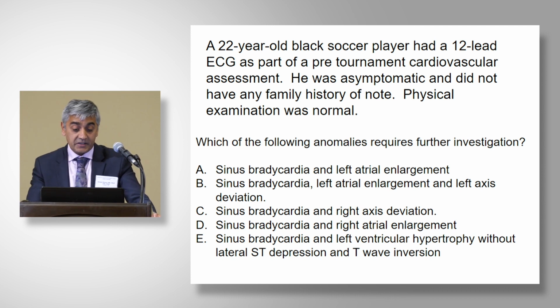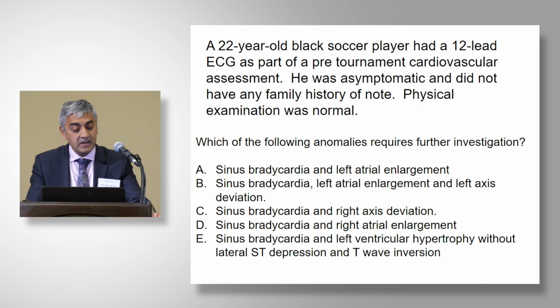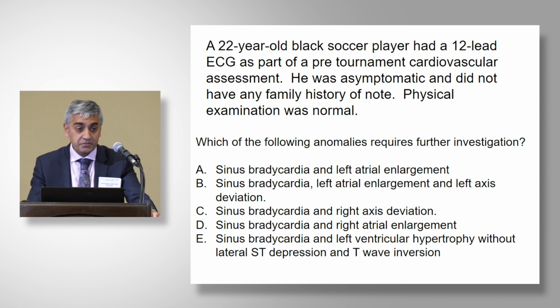A, sinus bradycardia and left atrial enlargement. B, sinus bradycardia, left atrial enlargement and left axis deviation. C, sinus bradycardia and right axis deviation. D, sinus bradycardia and right atrial enlargement. And E, sinus bradycardia and left ventricular hypertrophy without lateral ST segment depression and T-wave inversion.